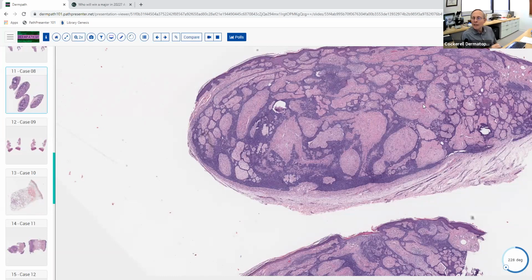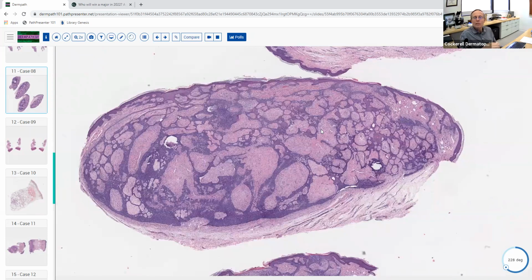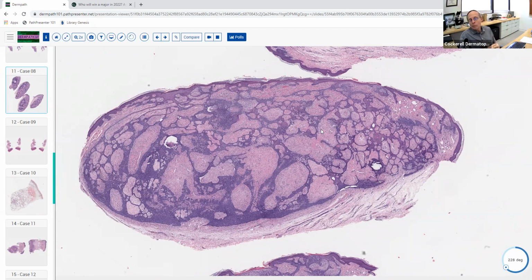So these people come in and they may have had this for 25 years. And maybe they say, well, my bra strap's starting to bother it, or maybe my belt buckle's bothering it now, or whatever. And you take a biopsy and this is what it looks like. And it hasn't ulcerated, it hasn't gotten larger. So it's really a very low-grade lesion. Probably, if they hadn't called it to your attention, it might never have been biopsied. So a lot of these usually come in as rule-out skin tag or nevus. Nobody really thinks of them as a basal cell, and then they get the diagnosis back, and usually go back and re-excise it just to make sure it doesn't come back. But it's obviously a low-grade lesion. This is exactly what this is: fibroepithelioma of Pinkus.